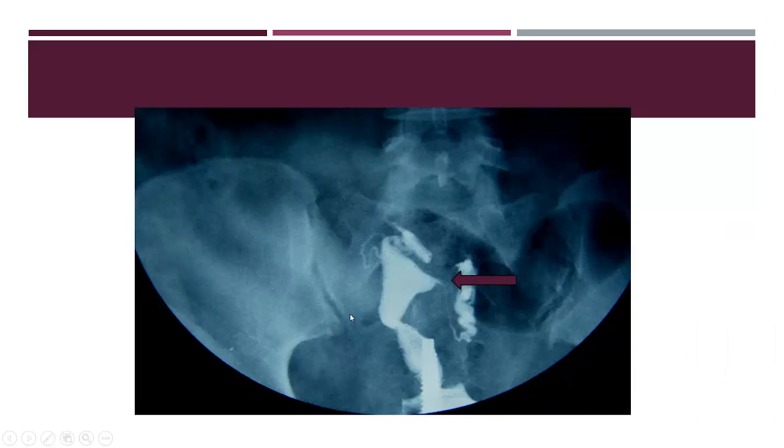Another case, the fallopian tube here appears unhealthy, mildly dilated, with a vertical course. This is the vertical course of the fallopian tube. And on the second sequence, you find that the fallopian tube becomes more dilated. And there is also loculation of the dye in the control film, meaning there are also pelvic adhesions. So we have fimbrial adhesions and we have pelvic adhesions.